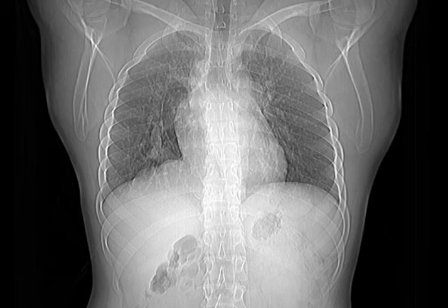And is it scimitar? Describe first. Okay. So there is a vessel-like shadow extending from the lower lobe and passing the diaphragm down to the liver. And the thing is, as it goes down, it becomes bigger or wider. Okay?